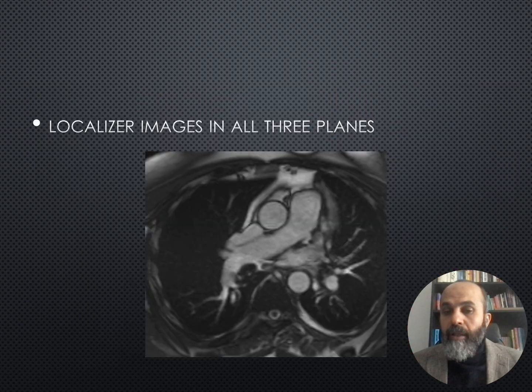It was a cardiomyopathy study. Similarly, here that was a report saying ARVC because they requested the clinical data, dilated right side, suspicious of ARVC. Yes, everyone in the room is saying there is a partial anomalous, and this case had an ASD as well. So from the localizer you could identify anomalies, and this would let you plan the entire scan. If I knew that this is a congenital, then I will not give contrast.